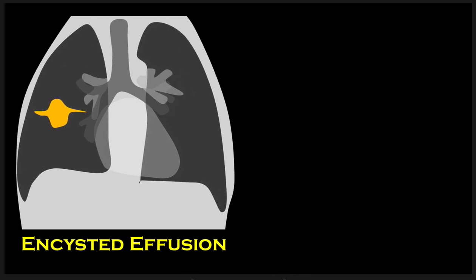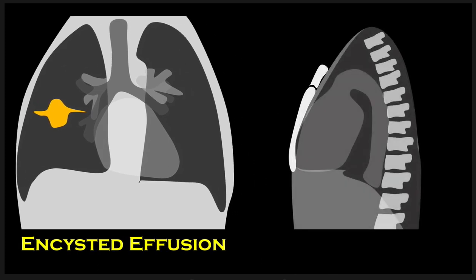What's actually causing this, we'll get a lateral view here, and I'll draw the fissures in, is the fluid sort of right there. And if you get a lateral view and you're lucky, arms out of the way, you'll be able to see that, sure enough, there's that fluid. And this is often seen in conjunction with sort of the standard look of a pleural effusion on that side. Short interval follow-up, it'll go away if you're confused, or you could get a CT if you really needed to. But in the setting of an effusion, get something that looks like that, centered right there, that's what it is.